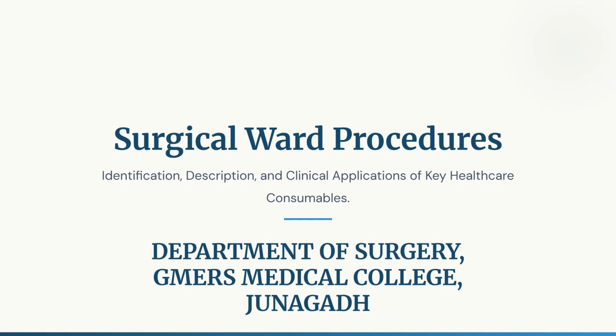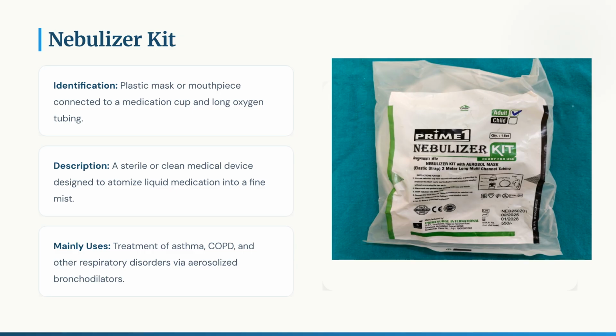This video covers surgical ward procedures, focusing on the identification, description, and clinical applications of key healthcare consumables. The nebulizer kit includes a plastic mask or mouthpiece connected to a medication cup and oxygen tubing. This sterile device atomizes liquid medication into a fine mist, mainly used for treating respiratory disorders like asthma and COPD.